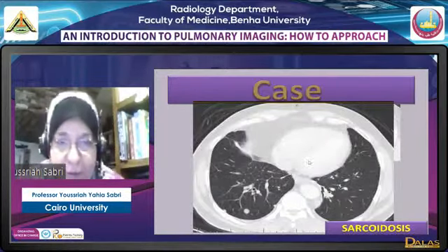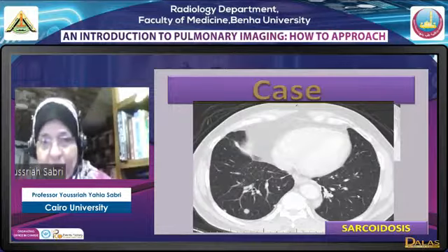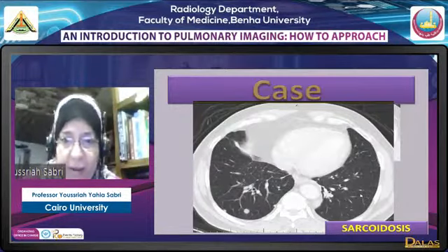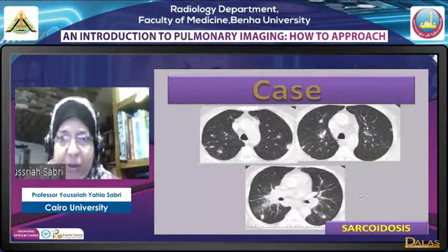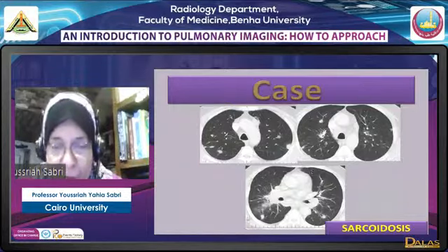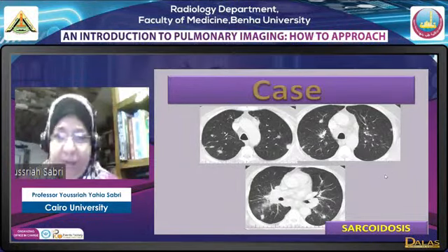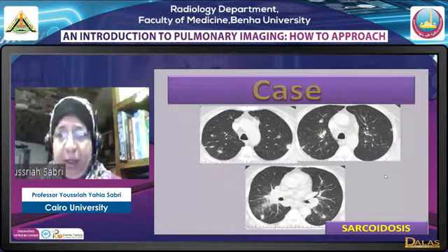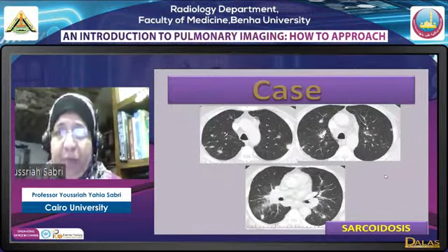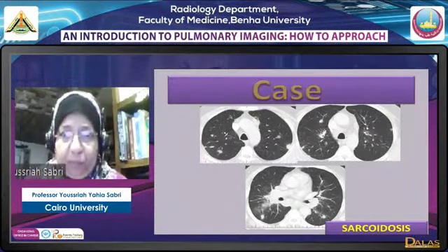Now here, if you see posterior on the right side, just posterior to the heart and the diaphragm, there are few prominent interlobular septi. There are also nodules. Okay, this is a case of sarcoid, and in sarcoid you see multiple lesions. Actually, you don't see single lesions. Okay, there are nodules, there are perihilar opacity, there are hilar prominence, there are prominent interlobular septi. Again, a multimorphic disease. The two classic multimorphic diseases, meaning a disease presenting with more than one appearance of lesion, are classical tuberculosis and sarcoidosis.